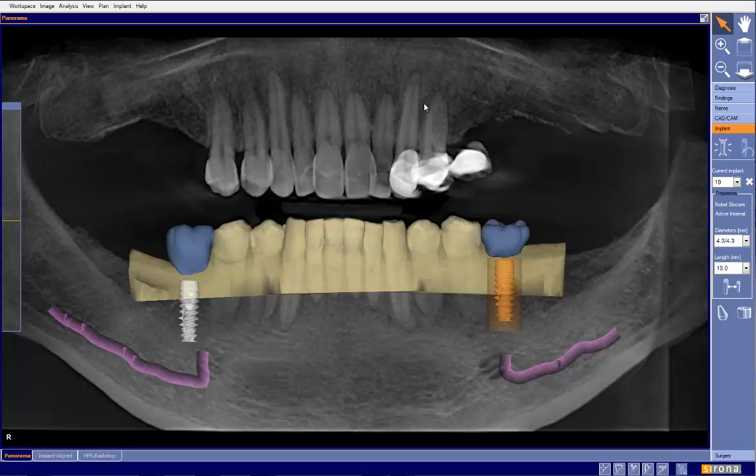Okay, we have another case submitted here for sites number 19 and number 30. This particular dentist is a CEREC owner, submitted CEREC design. His notes were that he has some questions on his designs, what could be better, how could it be improved in terms of the CEREC virtual wax up. I'll make some comments there.